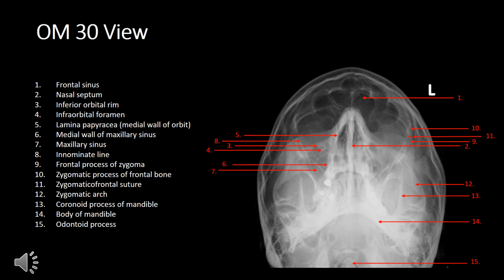And here we have the occipitomental 30, the OM30. Again, just refresh your knowledge of the anatomy. Pause the video if you wish, otherwise let it run and we'll move on.